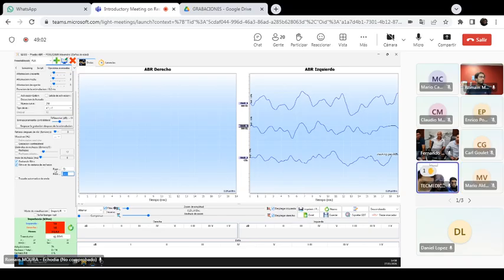Okay, that's great. And what about that other filter in the center? I see behind the time in milliseconds there is another filter. Yes, there are two filter steps. One first filter for each frame you will record. This is what we call the real-time filter. And this one is only the display filter.